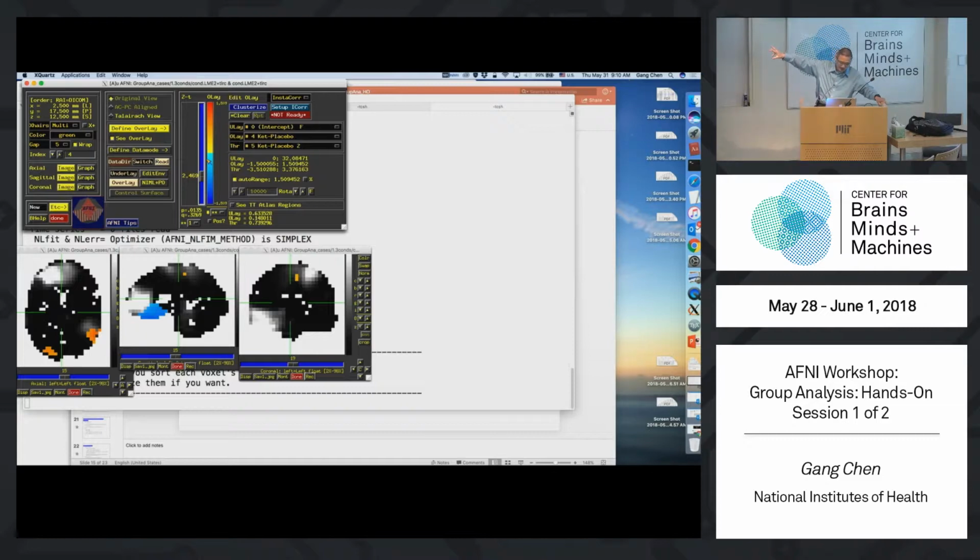The default, what you're seeing on the screen right now, the p-value under the threshold bar, is two-tailed. But if you can justify your choice, you can switch to one-tailed. How can you do that? You can use your right mouse button by putting the cursor on top of the threshold bar, then hold down the right mouse button, and that brings up a menu. On that menu, there's a sign. Currently you can see positive and negative both. So that's two-tailed, right?